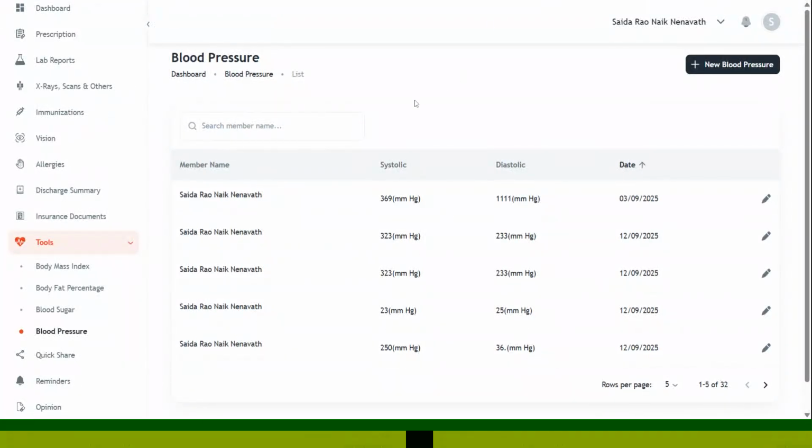Welcome to IndusAyush. I'll show you how to add and manage your blood pressure records.